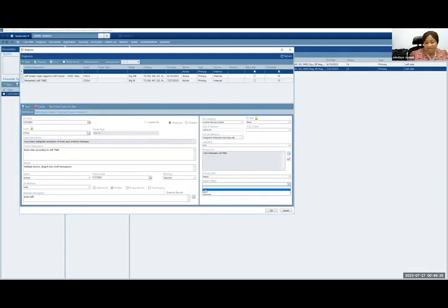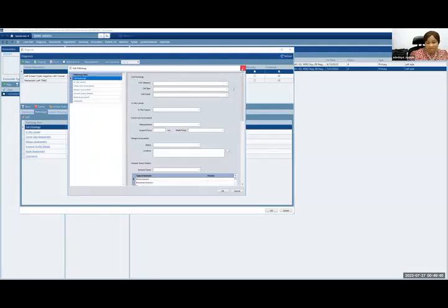Is this a distant metastasis? Yes, it is. Is this a recurrence? Let's say, no, it's not. This is progression of disease as opposed to recurrence. And so I've put all that information there, and I'm going to select OK. Again, if you have the pathologic information, let's say she's done a biopsy of that brain lesion and you want to fill in the pathology, you can fill all of that in here.